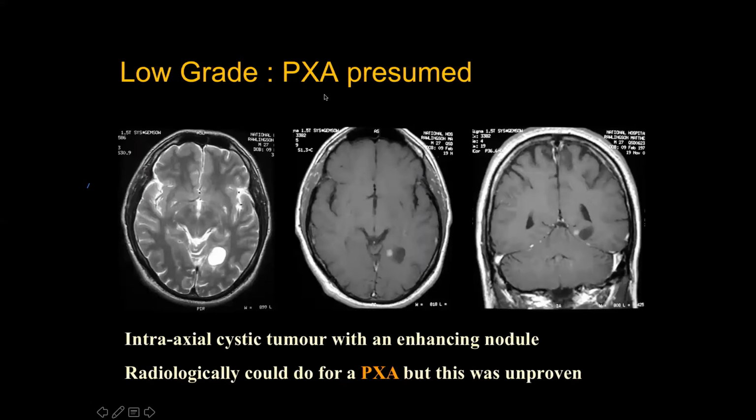And another very rare tumor is called PXA, pleomorphic xanthoastrocytoma. They tend to be a cystic lesion with mural nodule. They tend to abut the cortical surface, and when it abuts the tentorium, they can also incite a reaction. So based on imaging characteristics, a cystic lesion with a mural nodule, there are about 4 diagnoses: hemangioblastoma, PXA, ganglioglioma, and, what's the last one? Pilocytic astrocytoma. Okay, so based on imaging characteristics.